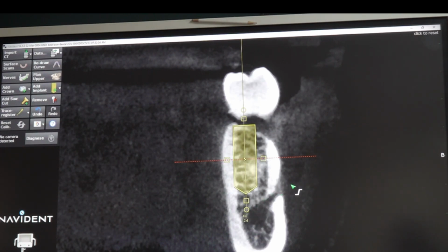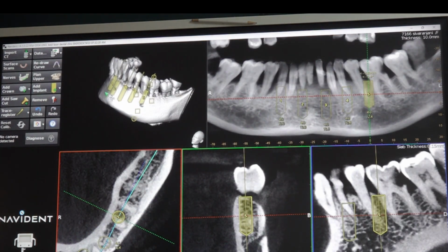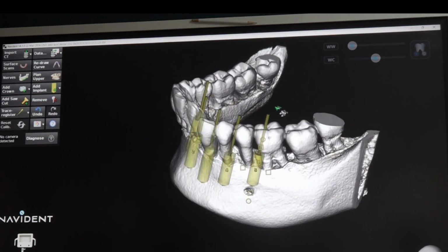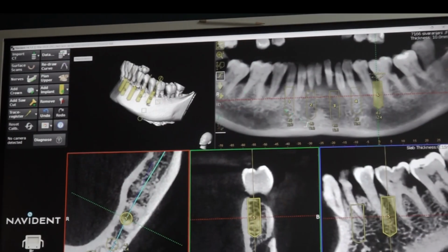That is the. Do you remember the question? Yes. Upward, buccally, and slightly distally. If you see from this view, the nerve goes like this. Then only it turns into branches.